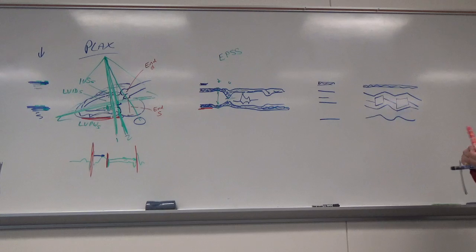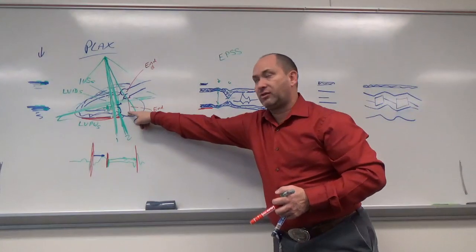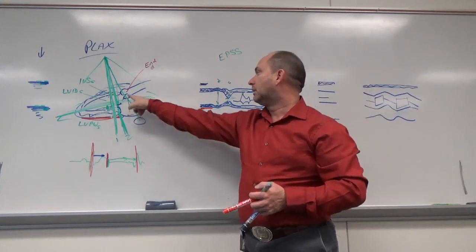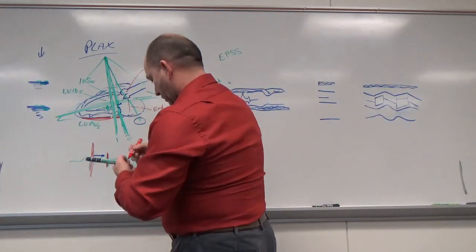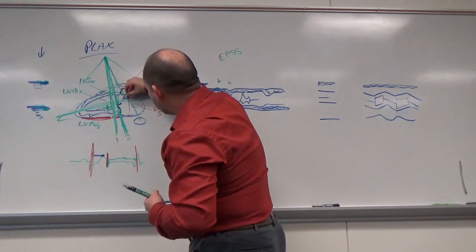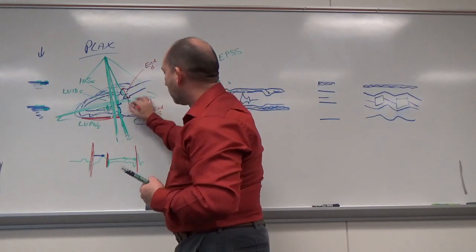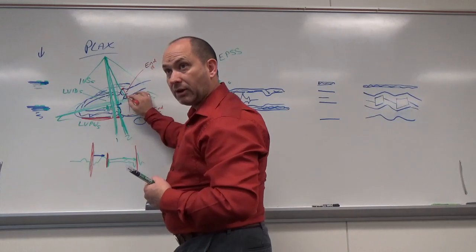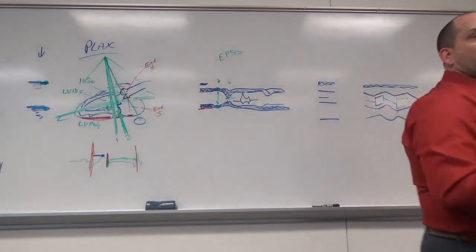And those are 2D? Yes, these will be in 2D. We're going to measure the left atrial size in 2D. You want the maximum perpendicular size of the diameter of that chamber. And then you want across the aortic root here. Let's do that in red. So aortic root is going to be leading edge to leading edge across here. And in systole, left atria is going to be perpendicular across the chamber direction. Leading edge from inside of the aortic root actually to the first wall of the posterior LA.